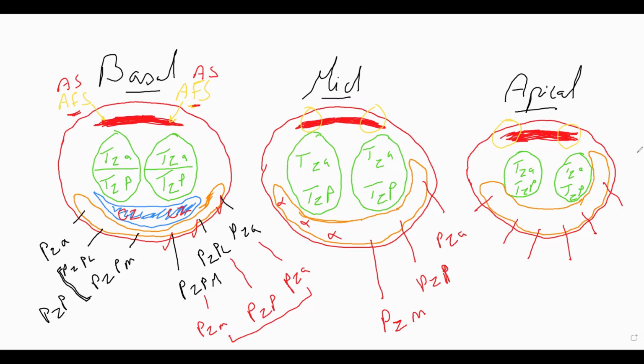So in total, our segmentation model of the prostate regarding the Pi-RADS version 2.1, we have regarding the transitional zone 4 segments at the basal, 4 segments at the mid-level, and 4 segments at the apical level.